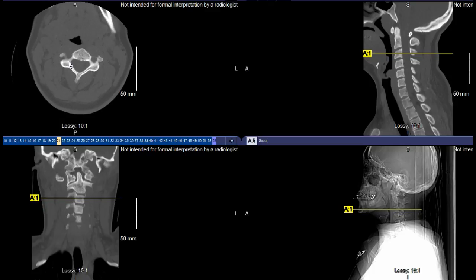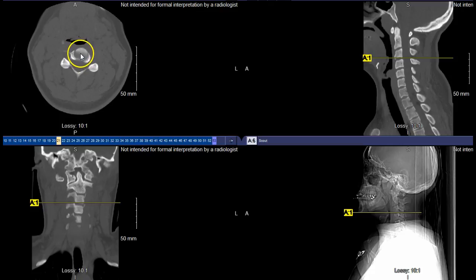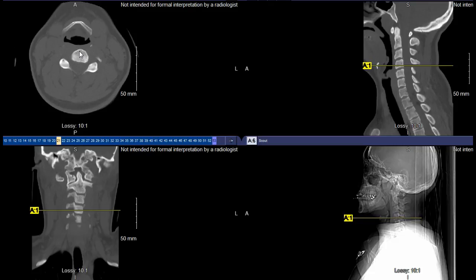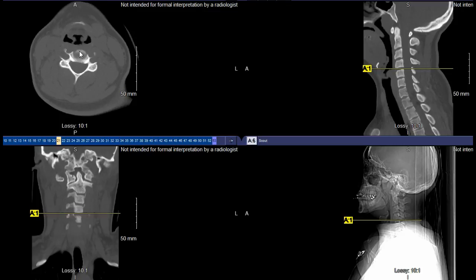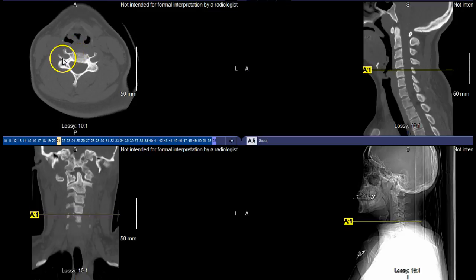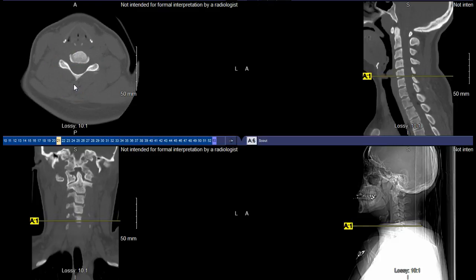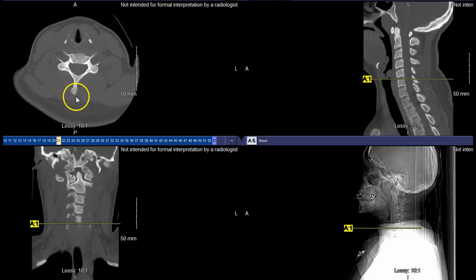As we can kind of continue to go down, you can kind of look at the disc spaces there. You can see actually the nucleus pulposus quite well on that particular slice, so you can see some of that disc. And working our way more and more inferior, again, utilize those key unique aspects to be able to say, all right, this is definitely a cervical vertebra because of this feature. And you know what those features are. We've mentioned those features.